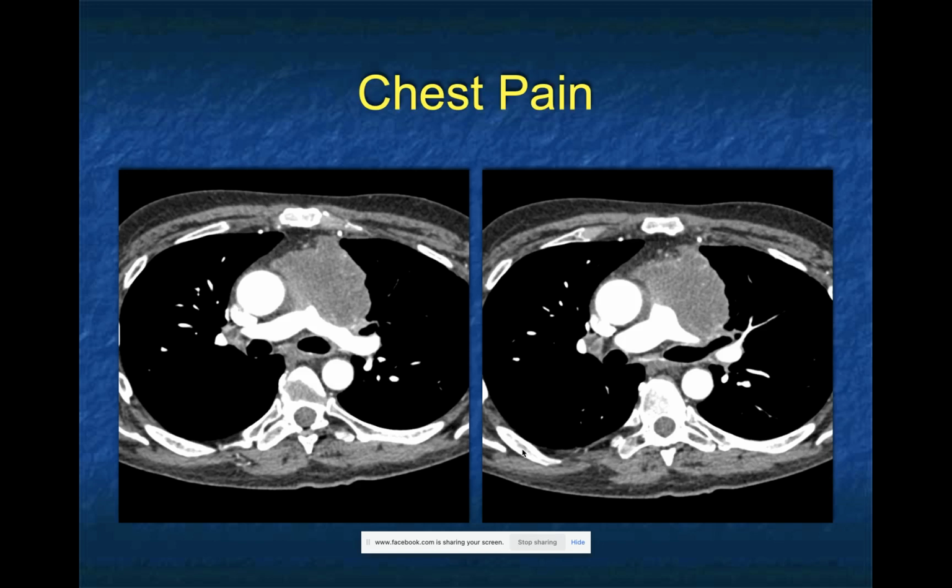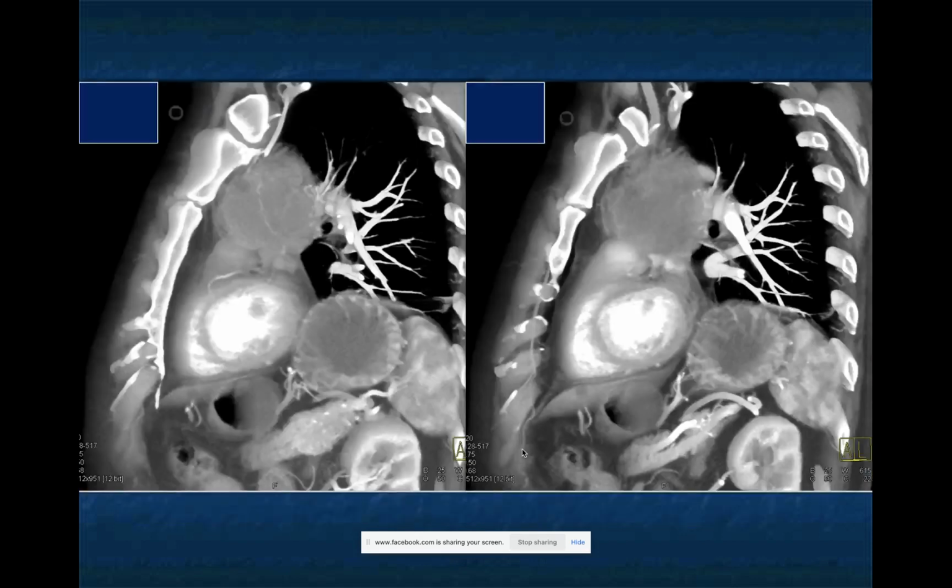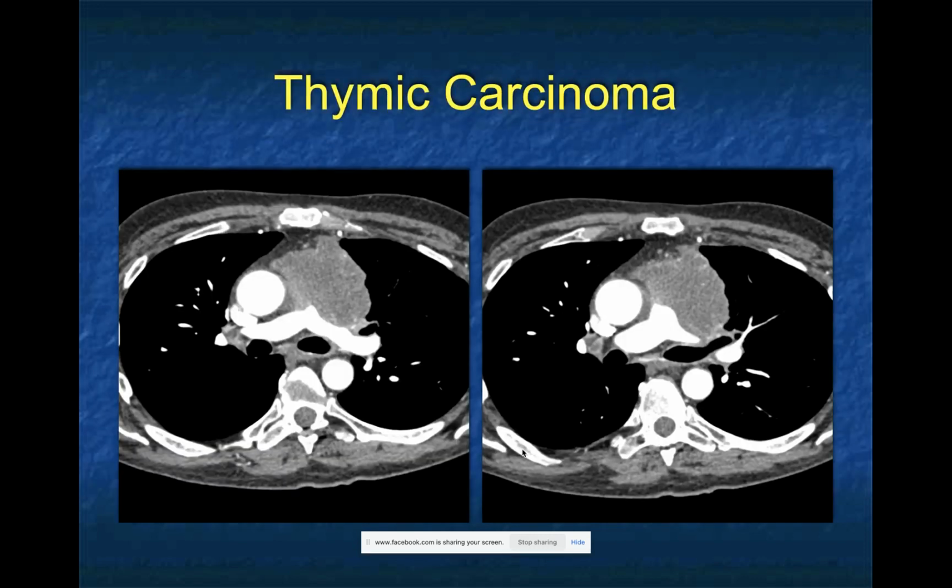What about thymus, thymoma? Well, it could be an invasive thymoma, but one thing to consider when you see infiltration of the mediastinum by a mass is a thymic carcinoma. Thymic carcinomas are more aggressive, they're often infiltrating, and Tony Lynn, who took this case yesterday, made that point and thought this would be good for a thymic carcinoid type tumor, a thymic cancer, and this indeed was a thymic carcinoma. So a good differential: anterior mediastinum, thymic masses, but there are multiple thymic masses, right? There's a thymoma. There's a thymic carcinoma. There's also thymolipoma, which is a benign lesion, but I'm not showing you that.